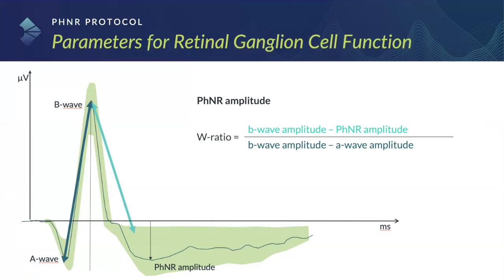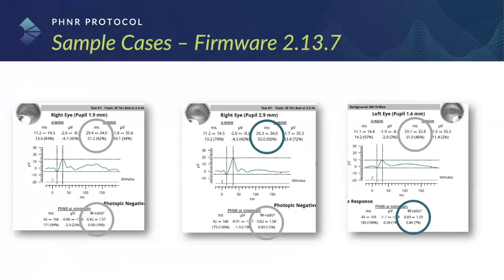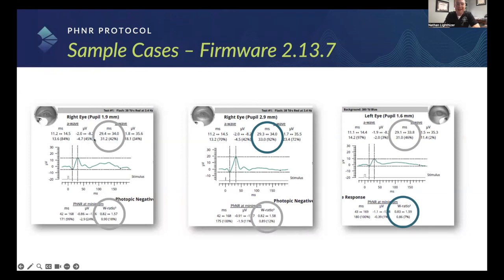The other thing that I look at is the B wave time. I'm looking at the time of how quickly that B wave is happening. And I want it to be the quicker, the better. The smaller the number, the better, because this is a time. When you compare it and put it in an age-matched reference database, I want the lower the number, the better. If it's 89% or higher, that indicates dysfunction.